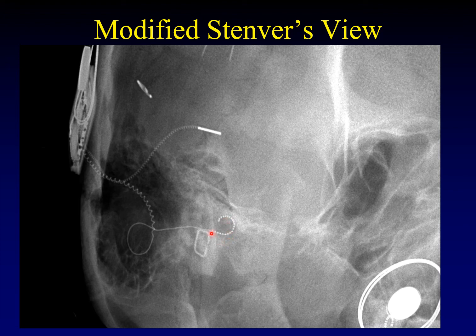So, for example, in this case, I'd say we're not quite 360 degrees. Maybe we're at 270 degrees of implantation, where about 20 of the electrodes are within the cochlea. That's how I'd assess this implantation. And of course, I'd indicate that it was appropriately positioned within the cochlea itself.